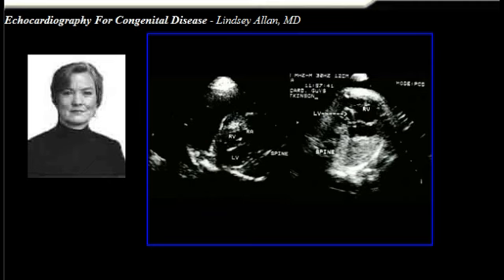But when we looked at the same patient at 32 weeks gestation, what we can see is the typical appearance of a hypoplastic left heart syndrome. Now the apex is formed by the right ventricle, the left ventricle looks like a little shrunken chamber, but in fact it measures exactly the same as it did at 22 weeks gestation. It's just that the rest of the fetus has grown, the left ventricle has stayed the same size because of the lack of flow through it, and the left ventricle has become a typical hypoplast, and at that stage there was aortic atresia.